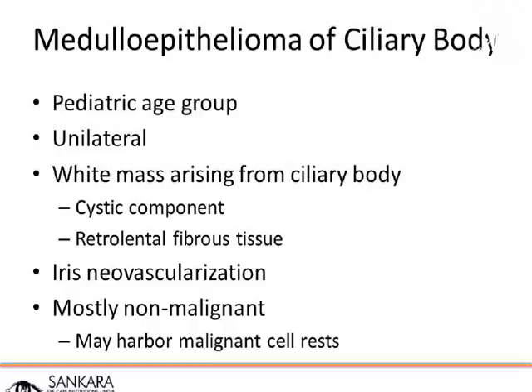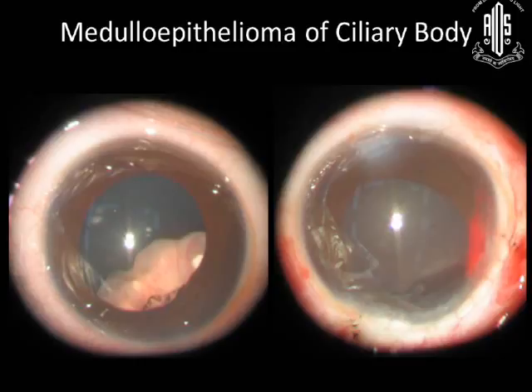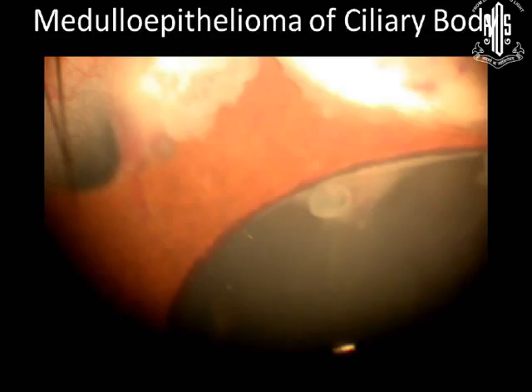And mostly it is non-malignant, but most of the time we land up enucleating the eye because there can be malignant cell rests. So there is a very small possibility of saving this eye by resection. So this is one such patient with a cystic medulloepithelioma. This underwent resection. You can see this is a post-resection iridociliary resection. So you can see the rubeosis.